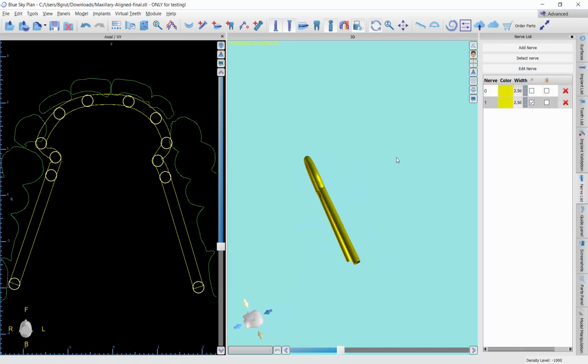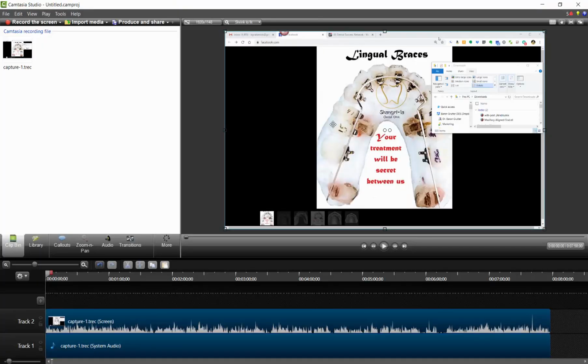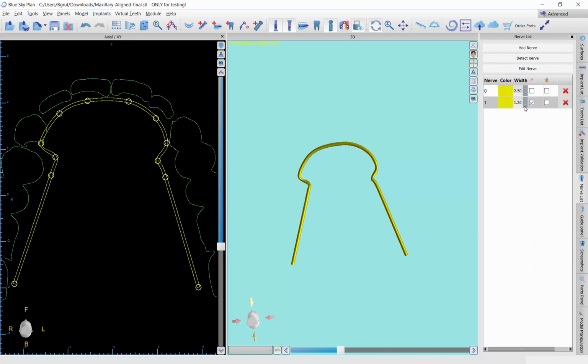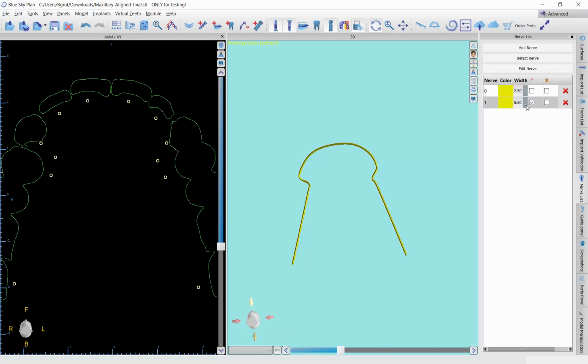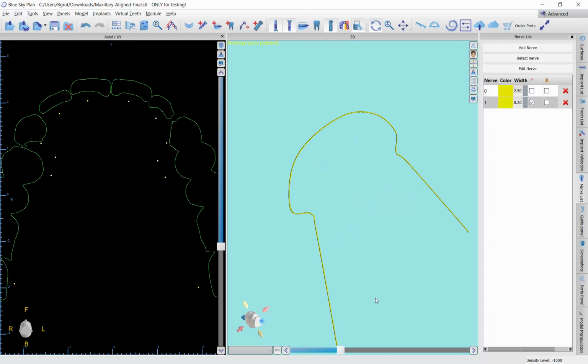Again, it's flat and a little more akin to this wire right here. And if you want to change the dimensions, you can always dial it down. Even if you're doing a truly make-your-own wire, this would be an 040 wire, which is pretty big actually. 020 looks tiny, but that's a pretty common wire size.